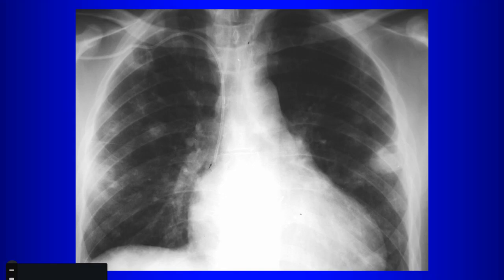So the finding on this chest radiograph is nodules. Left pleural base, there's a line. Anything funny looking about these nodules? Some are cavitary, yes, some are cavitary. You're only allowed one guess. If you're only allowed one diagnosis on this case, what would it be? Why?